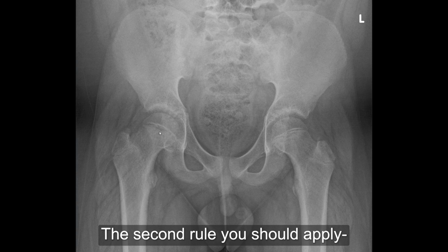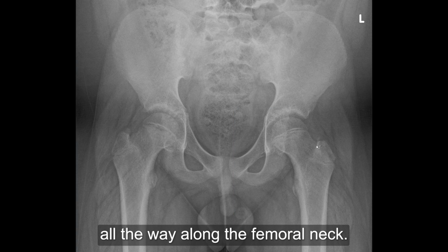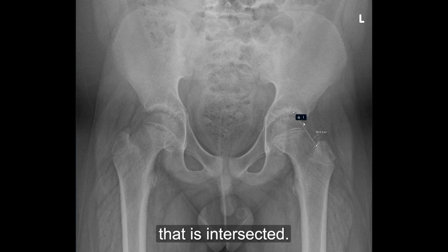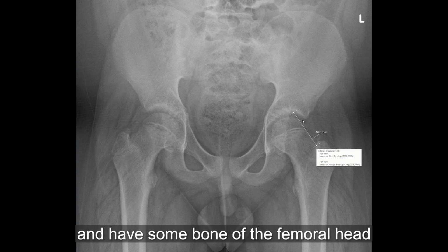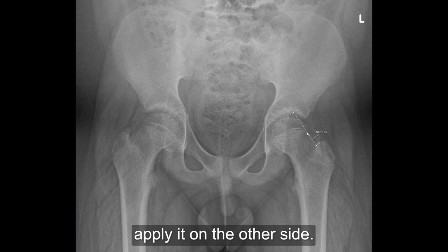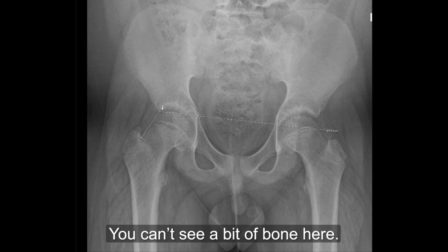The second rule you should apply is to create lines. Lines should start from the femoral neck and be drawn all the way along the lateral aspect of the femoral neck. And you can see there's a wisp, a small area of bone that is intersected. The line drawn on the lateral aspect of the neck should intersect and have some bone of the femoral head on the lateral side of this line. Now, if we apply this line on the other side, we do the same thing, get it on the femoral neck, and then draw the line. You can't see a bit of bone here.